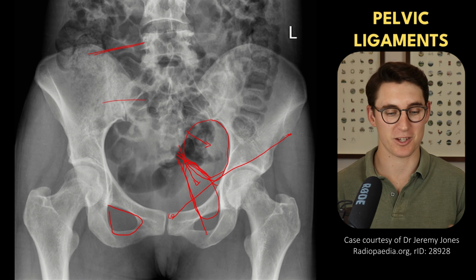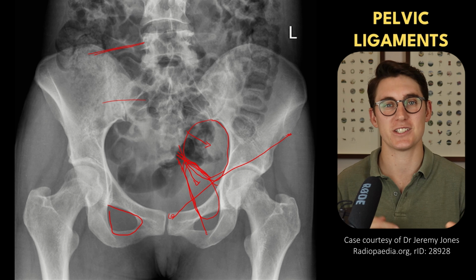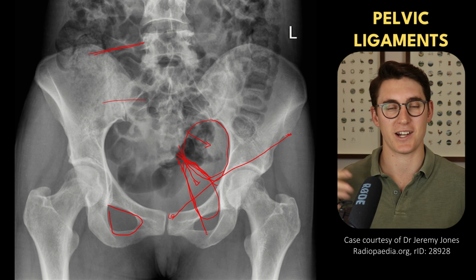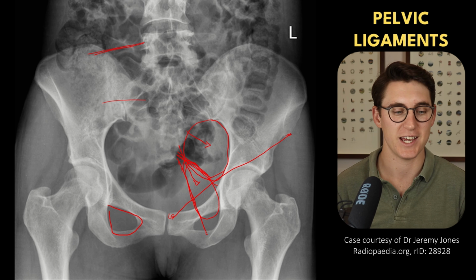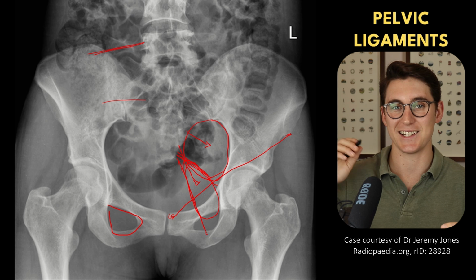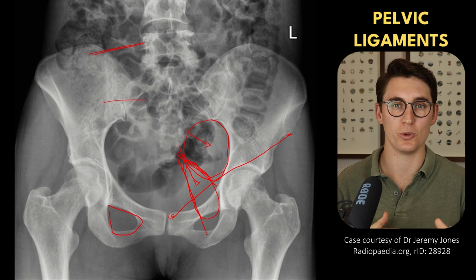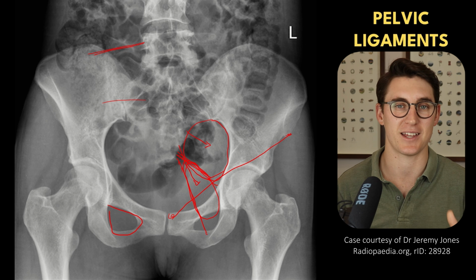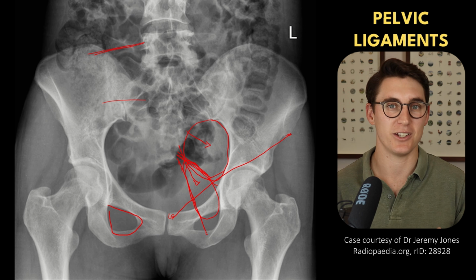So we've covered a lot. The pelvis at first glance looks quite simple, but there's so many bony features and muscles interlocking between one another and ligaments heading in all different directions. And the best way to learn this is to start by labeling the bony features. Become confident in identifying the various different bony features, and then think about muscle movement and where the muscles need to attach in order to create the movement that that muscle functions to do. But knowing where these muscles attach can be really important.